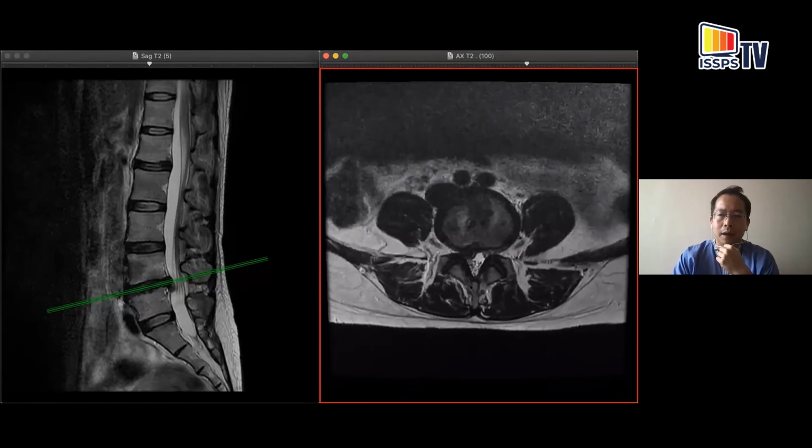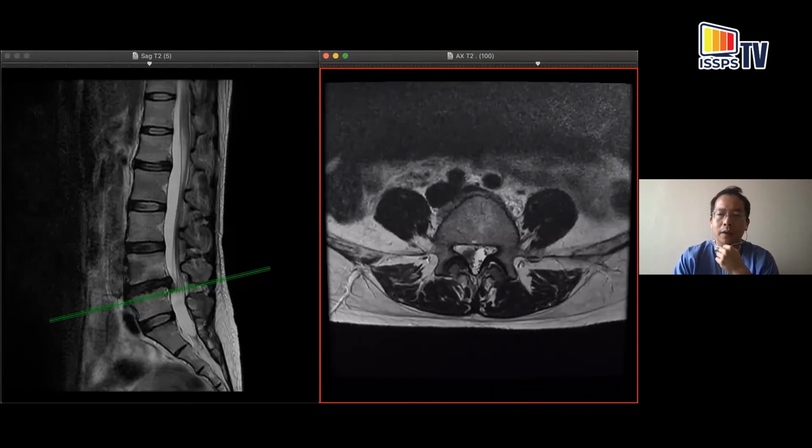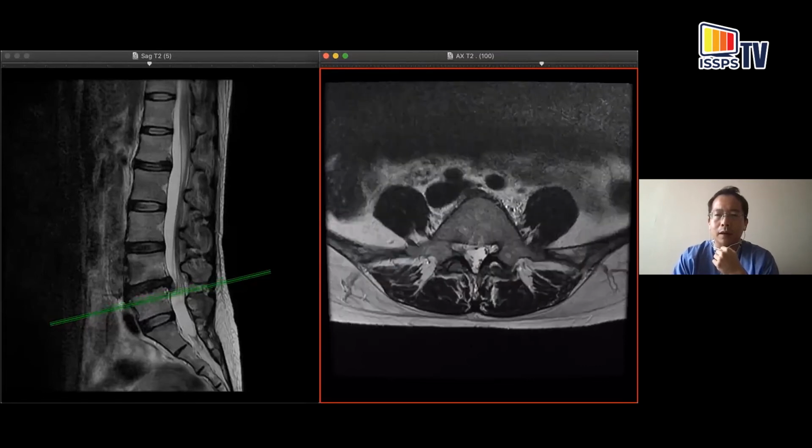That's the lamina. And if you look at the interlaminar space over here at L4, L5, this is where you would want to approach if you were to go in with a needle in the interlaminar space at L4, L5. There's really not much space there. If you came in from the side of the distorted thecal sac, you might have to enter even more horizontally. Otherwise, you would end up directly into the disc itself, which is a possibility. So it's important to bear in mind as well what the anatomy looks like at diseased levels, and best to try and avoid those if you can.